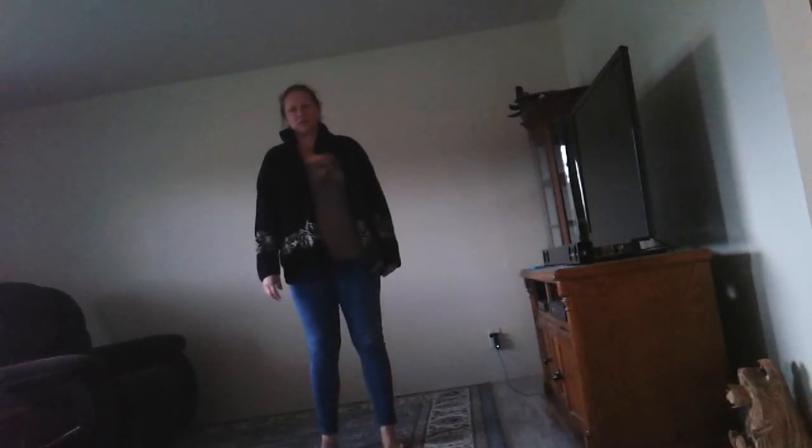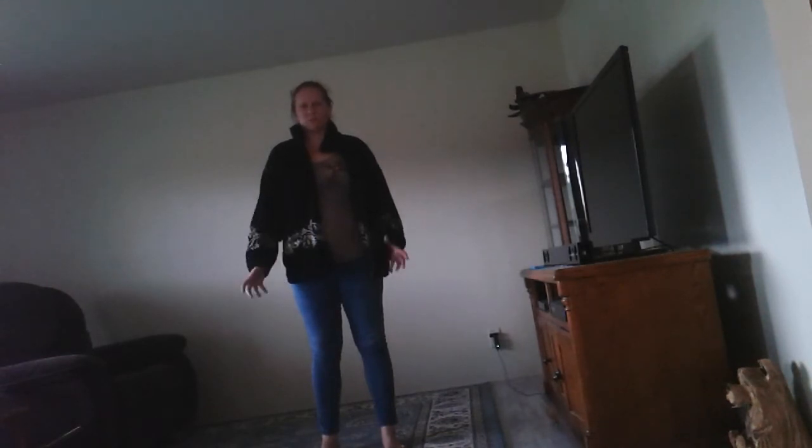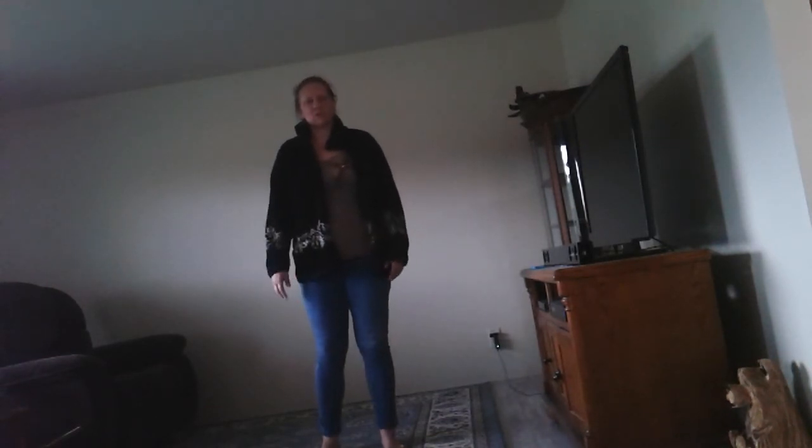I think you can see me now. My name's Amanda, and we're going to evaluate some images for the knee. I'm going to set the camera up so that you can see my cursor on the screen.